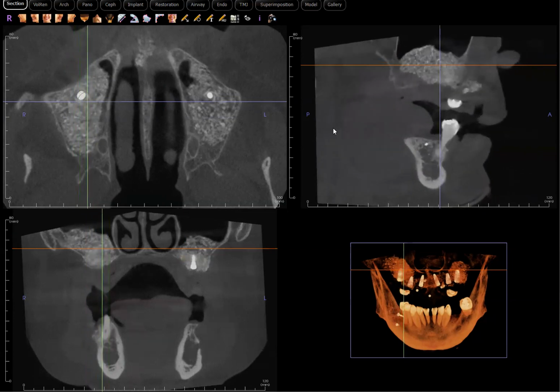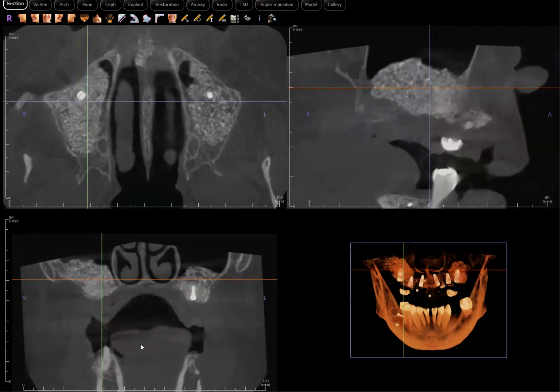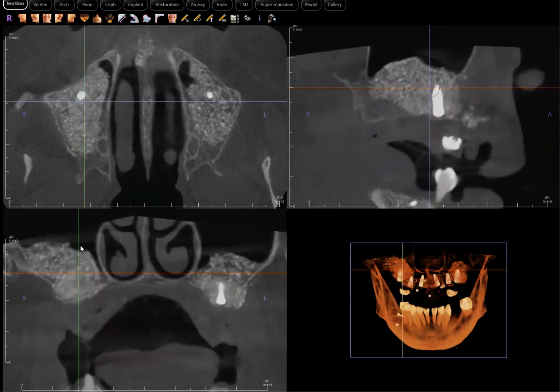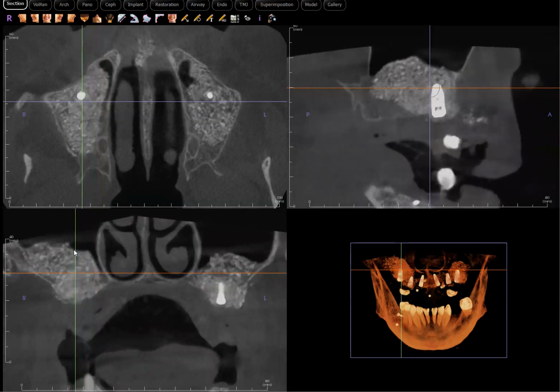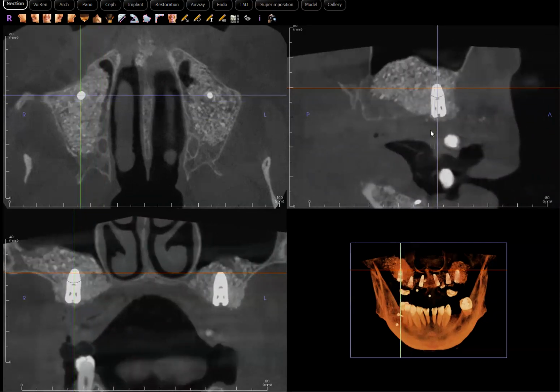I'm really impressed by not only the amount of graft the surgeon has placed, which is more than plenty for what this patient needed. And I guess that's a good thing. It's better to have a little extra than not having enough or an adequate amount of graft material.